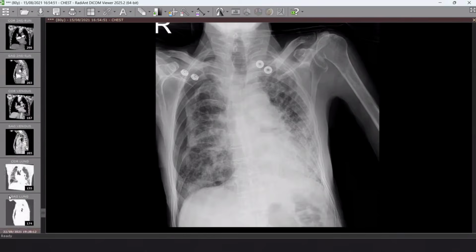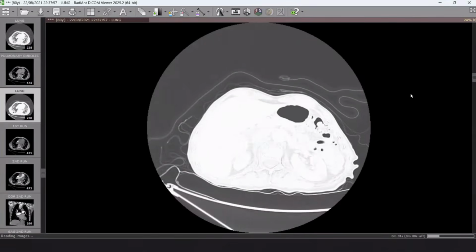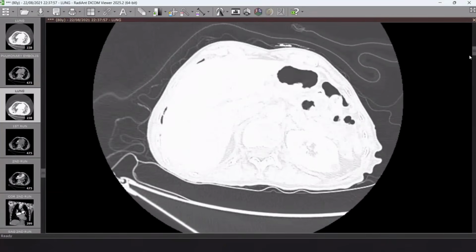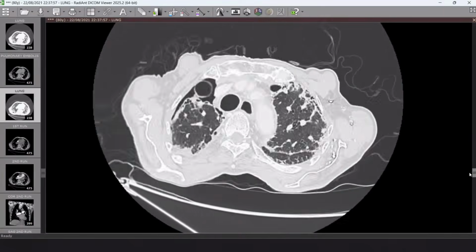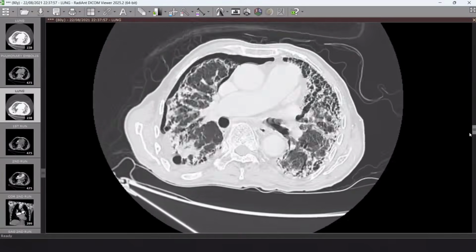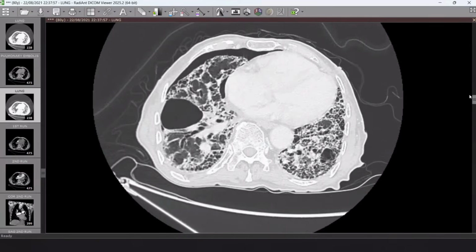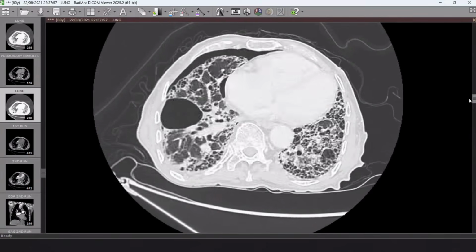Okay. This CT scan for the patient. Okay. Let's review the CT scan for the same patient. And I think it's very clear now to have UIP pattern. Yes. As you can see here, coarse reticulations and cystic honeycombing, and we have right side pneumothorax. I want to ask you 2 questions here in this case. First, do you have any explanation of pneumothorax in UIP patient?